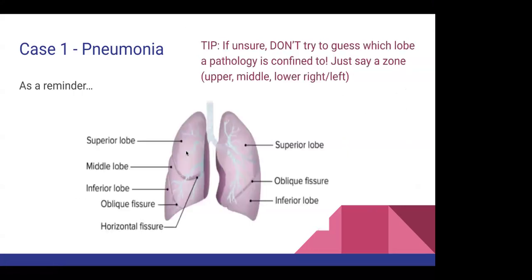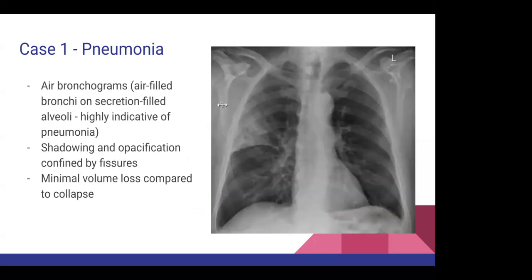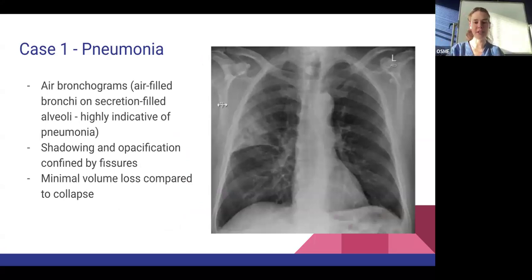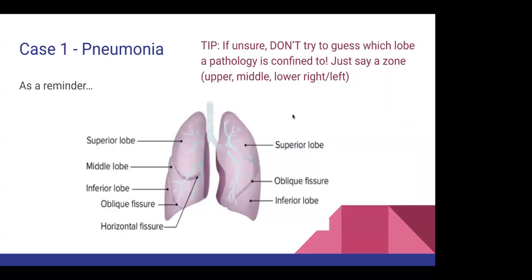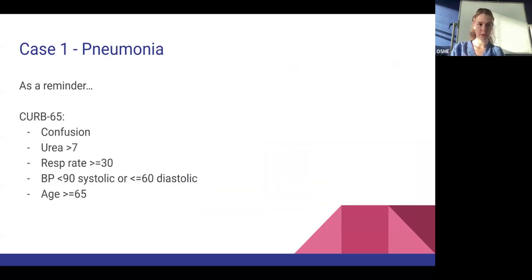Sorry, can I just ask, in the first image, it might just be me, but is the rotation slightly off or is it normal? Yeah, I completely agree with you. I think the rotation's off as well. That's a good spot. Especially, a really good way to look at it is the clavicles. They just don't look symmetrical. But realistically, none of the chest x-rays are actually going to be perfect. So it's good to just say that you think the rotation's off because patients wriggle.